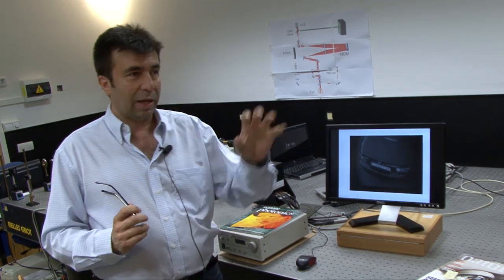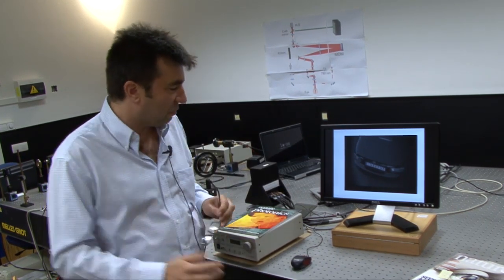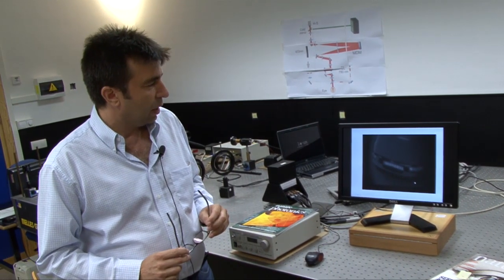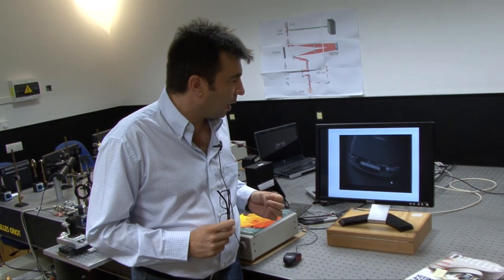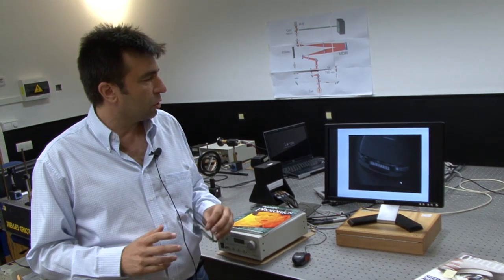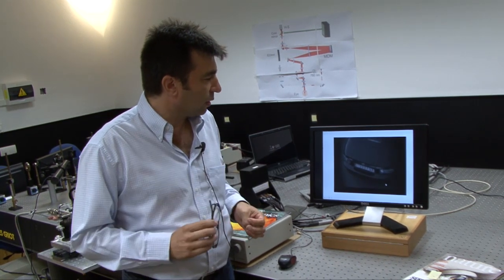Imagine I'm driving and I see a car in front of me and I cannot read the number. In fact, when I don't have my spectacles, I cannot see the numbers. If I correct it, I can see. And if I could have some kind of super spectacle, using this type of instrument, we can correct all the defects. We can really read the number, and it's a situation that we call a type of supervision. So we can have a better vision than normal by correcting these aberrations.